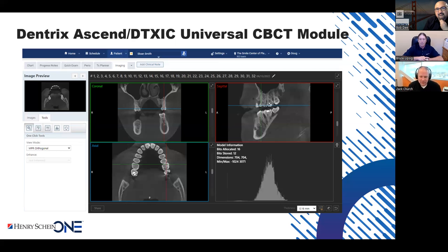It's the same product, and that I think is surprising to people, what we've been able to do with simply using a browser. Yeah, that's that rote look and feel, keeps all the tools in the same place with the same look, and to be able to move those size images in the browser was truly magic. And it takes a lot of black magic to make that all happen properly, and loading in the background, and a lot of smarts that are going on there to work with three-dimensional images.